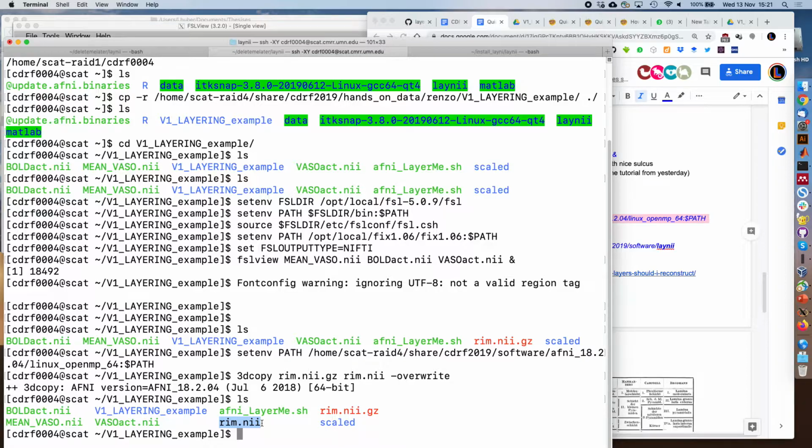Do you need help? Yeah. Let's try it real quick with control 1. Okay, never mind. Yeah, control 1 didn't work. And this is on the server now? I didn't do it manually. Well, that's because I'm too late.